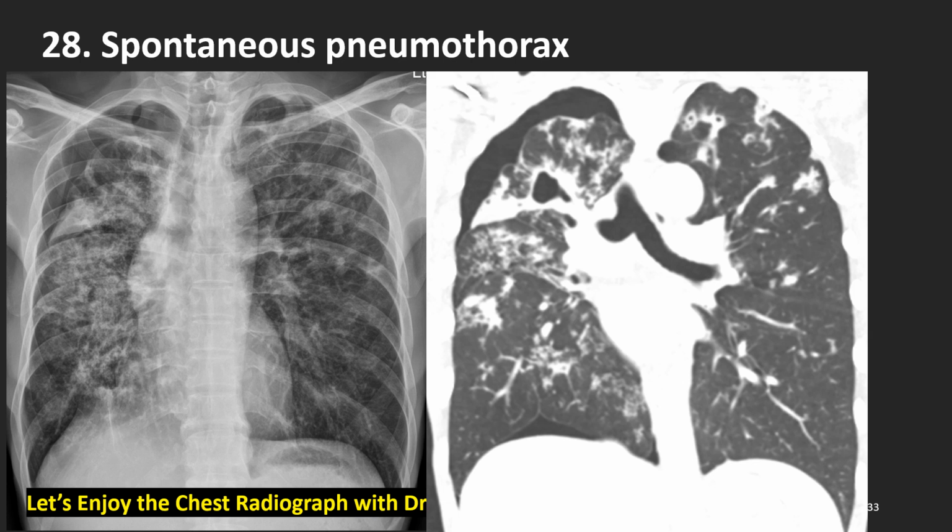Now we are watching extensive active tuberculosis findings of this patient everywhere. Every finding is active tuberculosis findings with one more thing. This is spontaneous pneumothorax. Tuberculosis is one of the lesions which makes spontaneous pneumothorax.